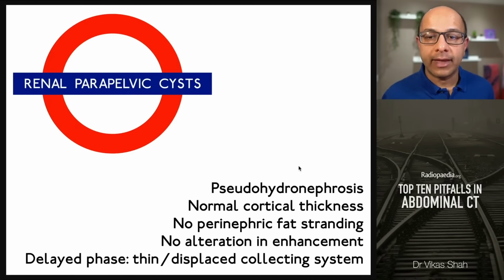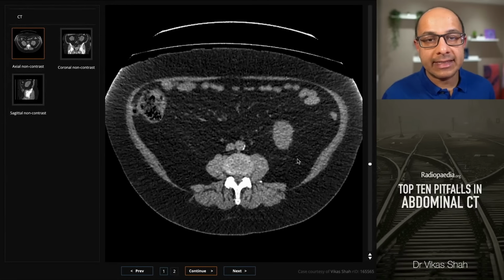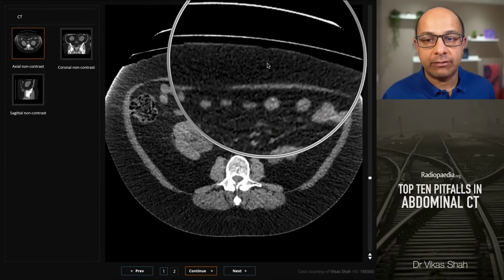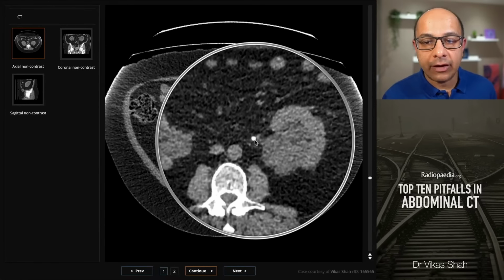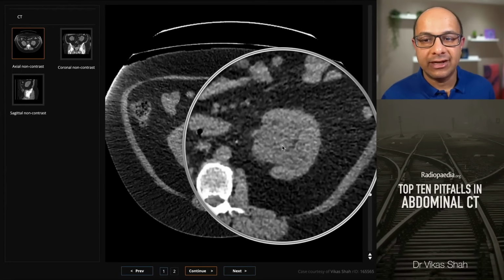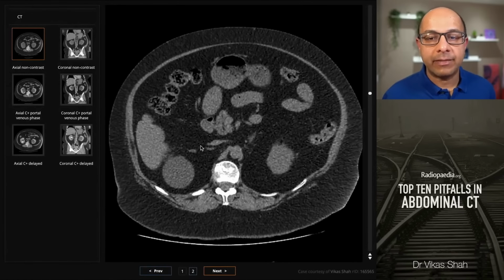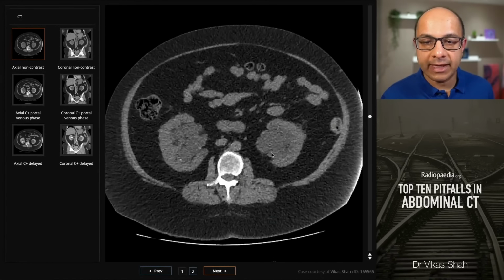So let's look at one more example. This patient presented with acute left-sided renal colic, and this CT urinary tract, again acquired prone. You can see the couch here anterior to the anterior abdominal wall, shows a stone in the proximal left ureter, but alongside that it also shows fluid-filled distension, apparent distension of the pelvicalyceal system bilaterally. So the patient was brought back at a later date for repeat study. By this time the stone has passed, but we've still got persistence of the appearance of the PC systems bilaterally.